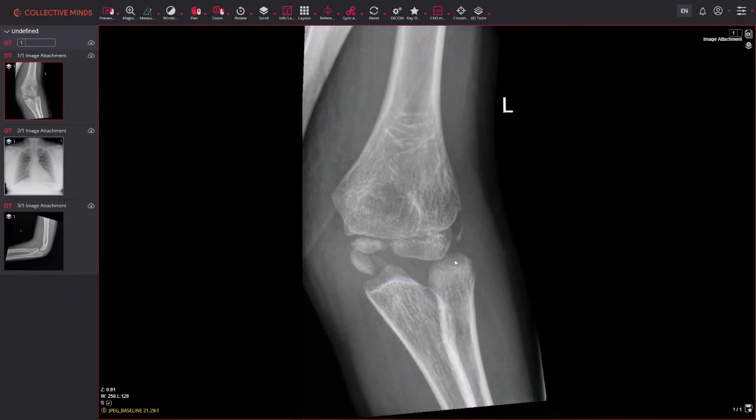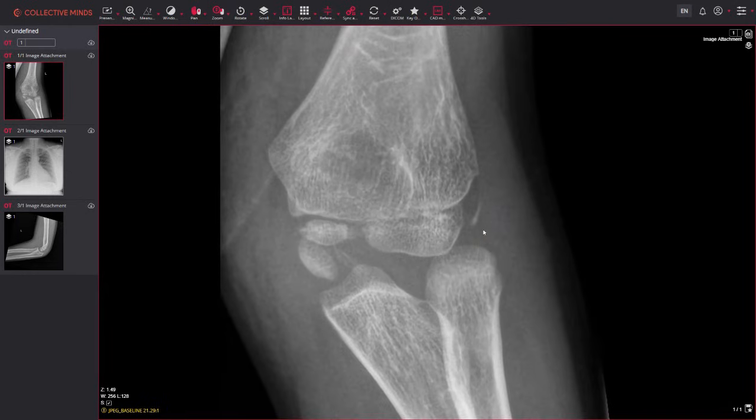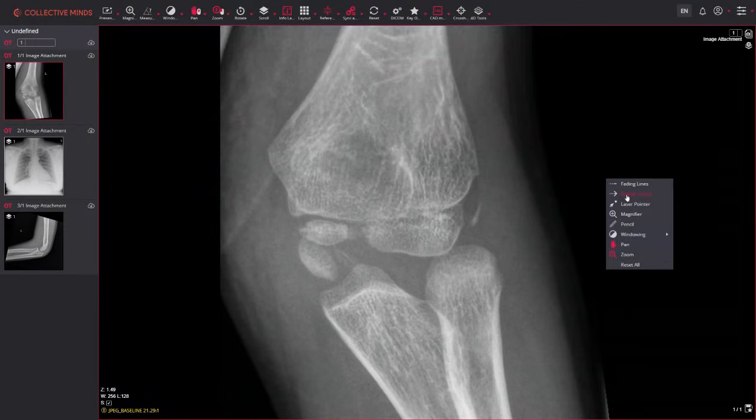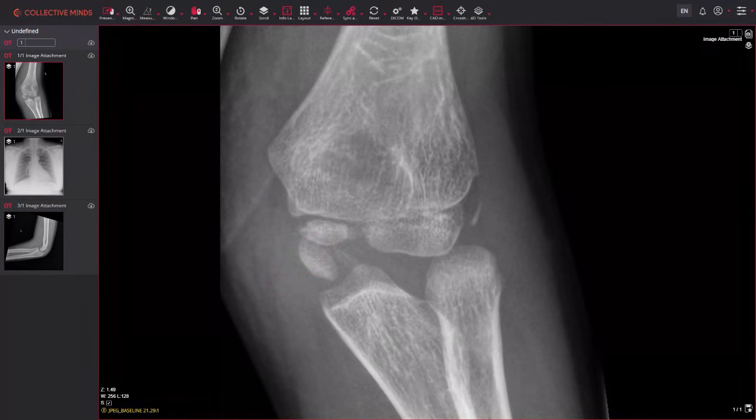So in this patient, immediately, this doesn't look quite right, does it? If we zoom in here, we can see that this patient's got to be 11 years or older because we're starting to see ossification here of the lateral epicondyle. But crucially, there's a gap where the bone should be at the medial epicondyle. And if we look down here, we've got trochlea, which is normally aligned here, but we've also got this bone density down here, which is in fact the medial epicondyle that's been avulsed distally.